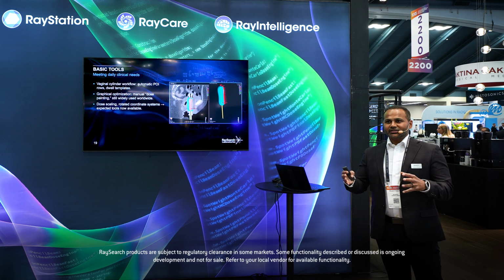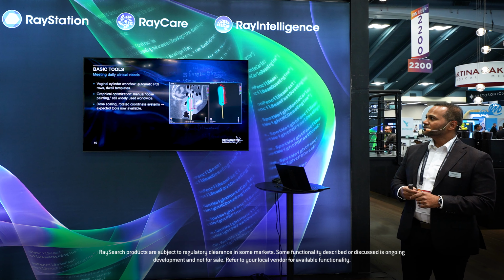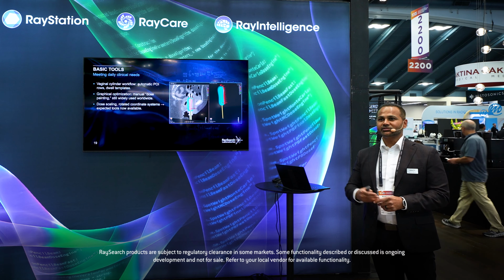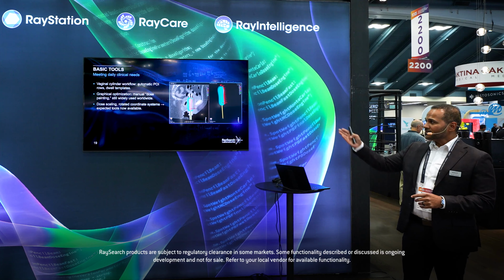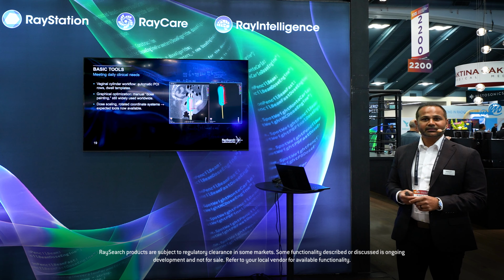Now, RayStation can give you the basic tools, the day-to-day needs of the clinic, being able to do cylinder cases. We can automatically put in dwell points. We have scripting, we have automation, we have protocols that really take advantage of that. Graphical optimization, that's something that many clinics still make use of. So you get dose painting, something widely used.